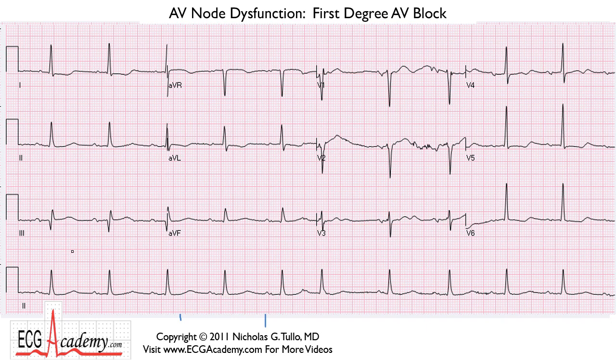If you look over this cardiogram, you can see there's a slight irregularity in that the QRSs do seem to march through, but then this beat comes somewhat early. You can see that this beat, if you had mapped it out, the normal beat would have occurred here. Instead, this beat comes a little bit early. We're going to talk about ectopic beats in a later section, but this happens to be an atrial premature beat because you can see a P wave that conducts to the ventricles. The P waves in front of all these beats are quite obvious.